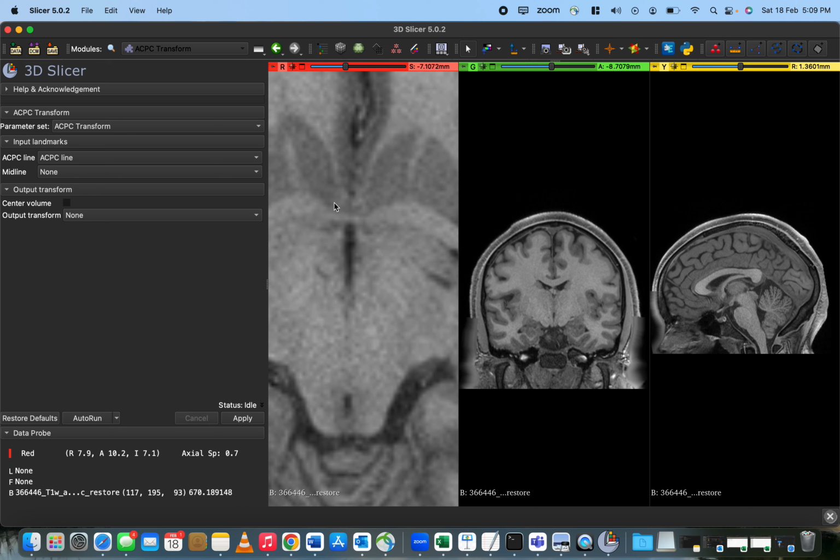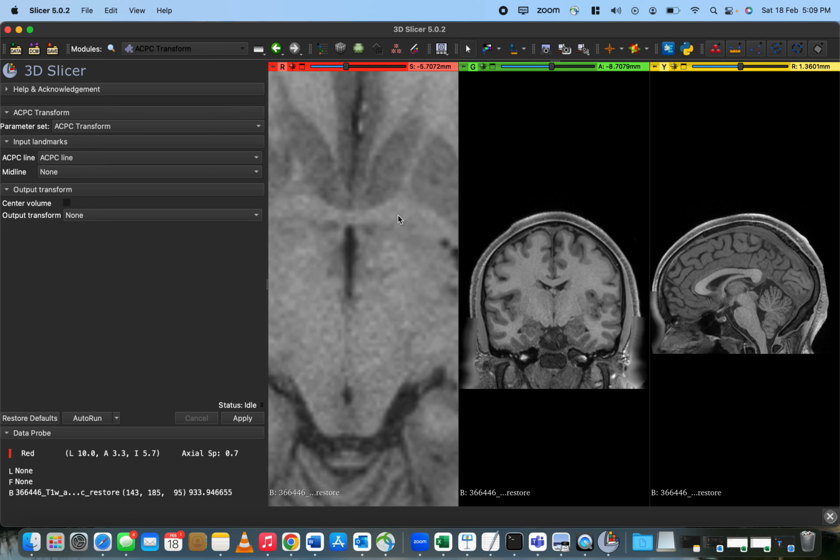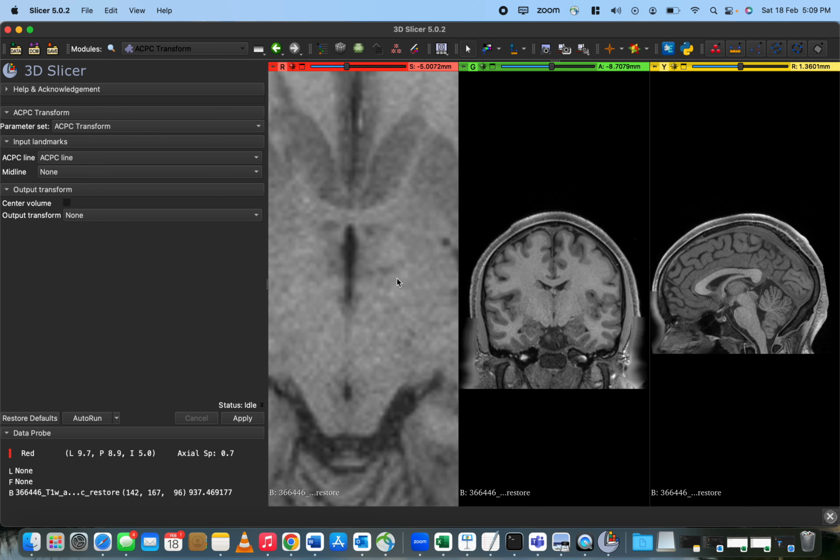So you can see the anterior commissure as a white matter bundle, and if you move back and forth between the slices, you can kind of see it. It's kind of animated and moves towards the midline. So if you focus on these bundles here, and then you can see them crossing, that's the AC.